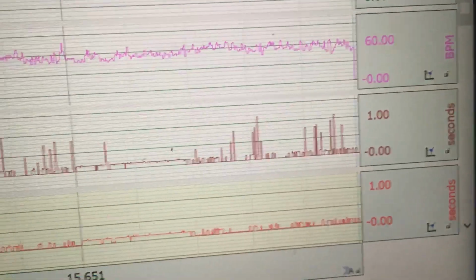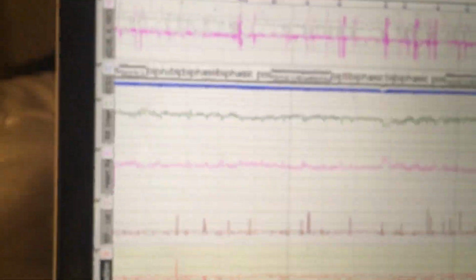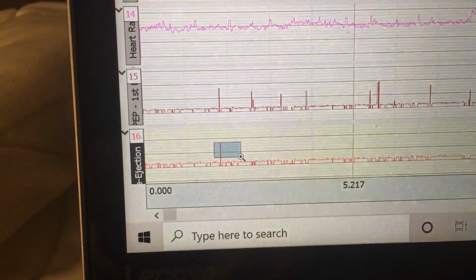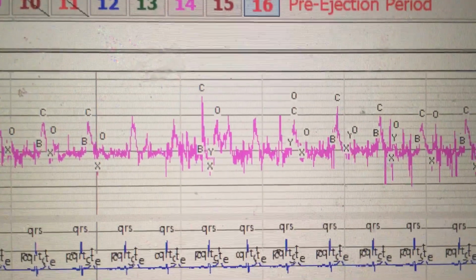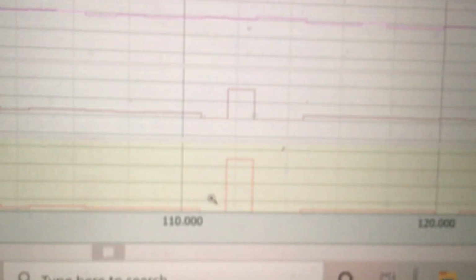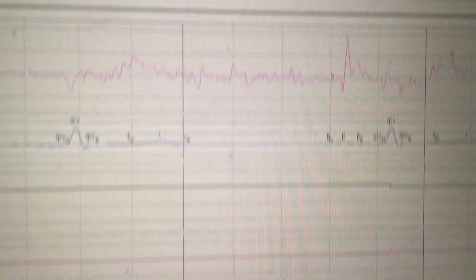It looks like I missed one back near the beginning. So I'm going to do one last check there. I'm going to take my zoom tool and see where this is. In fact, I'll just draw a tiny little square around it. And there I found my big uptick, and that's a problem, so I'm going to follow that all the way up and see what was going on here. And it looks like there's just kind of a mislabel. So I'm going to zoom in on this even more. I'm going to use this as my guide because this is where the problem was.